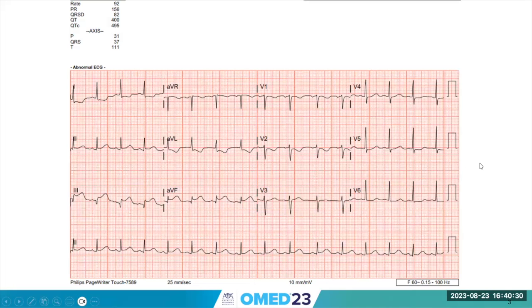As you know, in the emergency department and in urgent cares, et cetera, you're handed a bunch of EKGs all the time, multiple times a day. And one of the big things that we have to identify immediately is if something is a STEMI. I know that all of you can look at this EKG and identify that this is an inferior wall STEMI. You have the ST elevation, mostly in leads 3 and aVF, a little bit in lead 2. Understand you only have to have about 1 millimeter of ST elevation there.